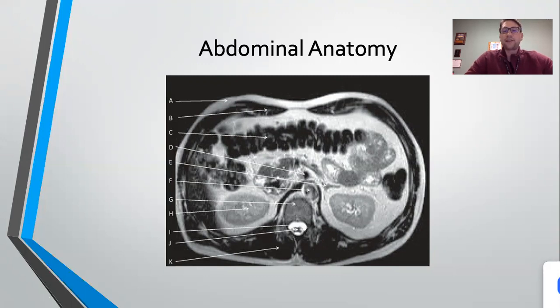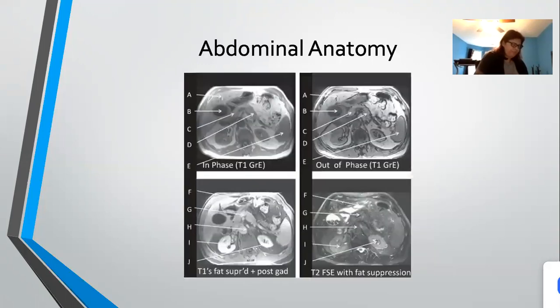So is this fat sat or not fat sat? Did I already ask that? No. Not fat sat. I think I already did ask that.